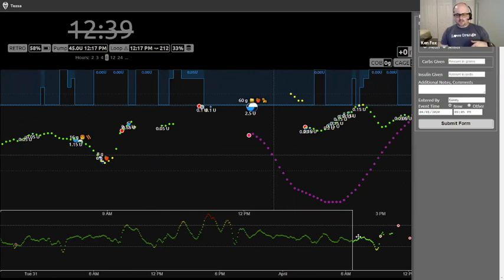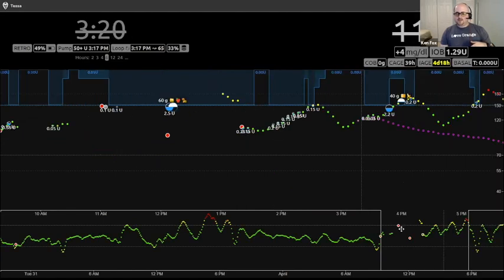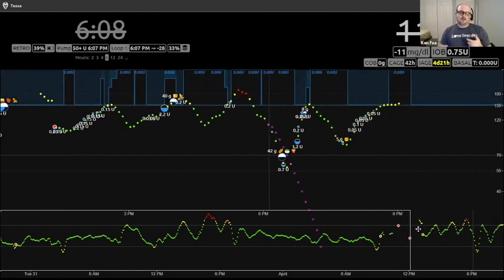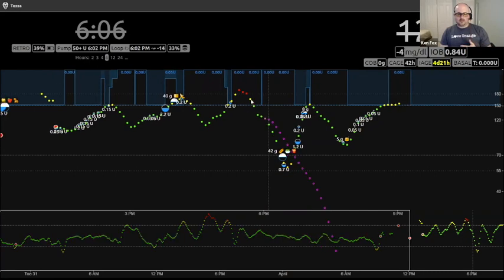I actually didn't put any in today. Let's see, I'll add one right now. The other fun one is to, especially if you're doing some analysis, you want to go back and look at your day, or want to learn from what's happening. I think it was right before dinner, so I'll log it. I think it was like here. What time is this? 5:41.